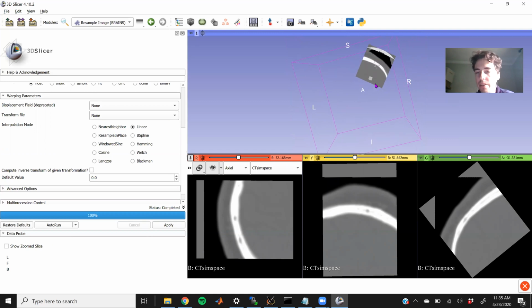But say you wanted to actually simulate way past the focus, you could either edit the transducer script that makes the transducer, or you could use the crop volume feature to make this transducer even bigger. You could arbitrarily shape the transducer file to be as big as you want and simulate as much as you want. So for now, we'll just call this good.